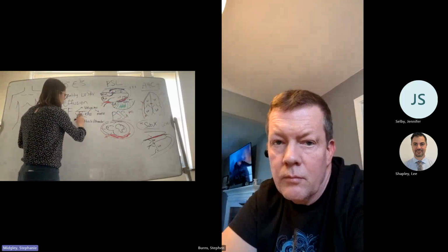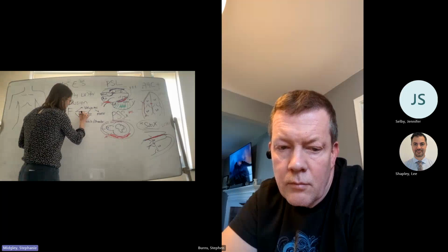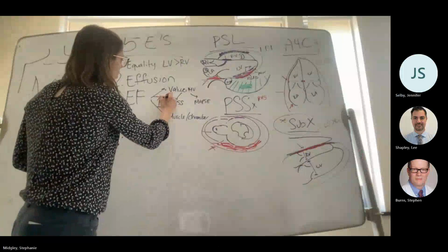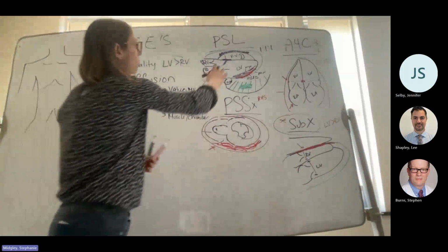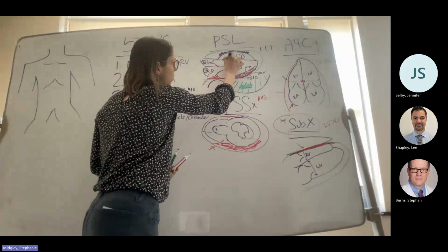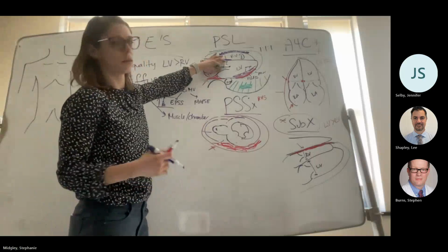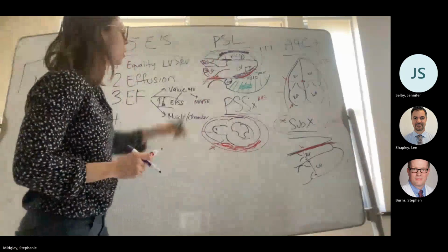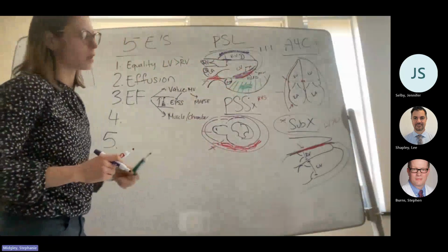If I have Nana on here, who's really old and has a cane, right? And she can barely jump. She's going to be really far from that ceiling. And so her function and her EPSS is going to be really diminished. So big space, poor EF, closed space or small space, good EF. So parasternal long, apical 4 are the 2 I can eyeball the EPSS.